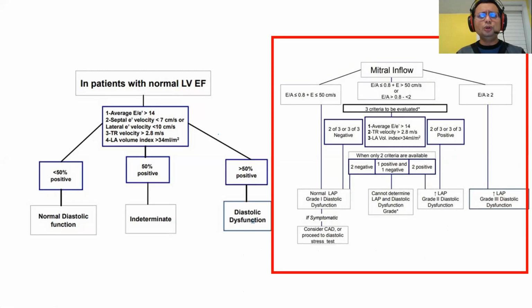So what is our conclusion for this patient? So this patient has critical aortic stenosis with poor ejection fraction and atrial fibrillation. The patient has diastolic dysfunction as EF is poor and the LA pressure is also elevated. However, I cannot grade because the EA is fused. The patient is in atrial fibrillation. So that is how you approach a patient with atrial fibrillation. Okay.